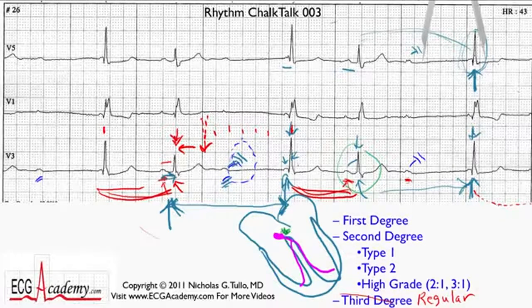But instead what happens, because this patient has AV block, we've already decided this person has second-degree AV block, the AV node must be pretty sick. And even the AV junction is pretty sick and it's not generating the proper beat. But somewhere down here in the Purkinje system, there is a healthy focus that's taking over as the escape. And because the beat goes down one bundle and then has to go back up to the His and turn around to go back to the other bundle, it kind of distorts the QRS complex.